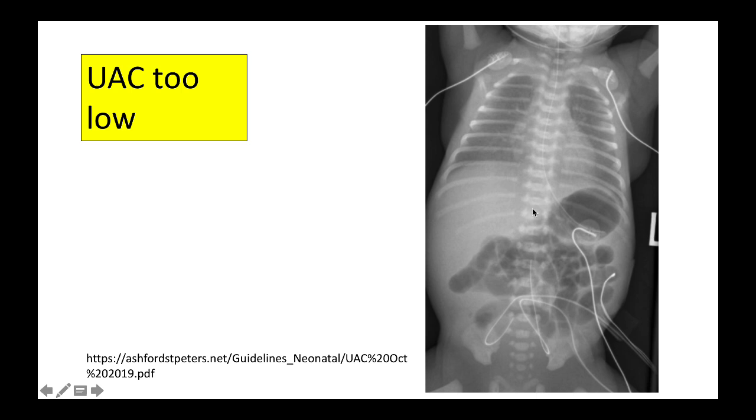It looks like here the team thought that this was the vein that they were catheterizing, because this seems to be another UAC here. But this catheter has ended up at about L2, so T12 there, L1, L2, which is probably the last place you'd want the catheter to be, because the kidney arteries come off from L2. So this would be a really good way to end up affecting the blood flow to the kidneys. Because this is going in the right direction, this catheter should be really easy to replace. If you're still scrubbed up, you can just thread it further up. But again, you never ever want the catheter to be at the level of L2.